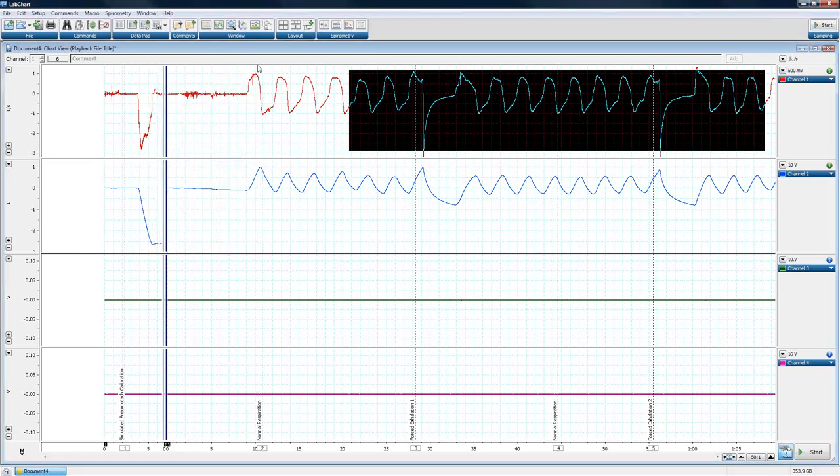Now we're going to talk about settings. We can access the spirometry settings from the spirometry menu. You see we have about 4 options here: settings, data window, flow volume plot, and report. But of course, we'll talk about these in turn later. However, right now I just want to talk about the settings of how to set up the spirometry extension to actually perform the calculations we want out of it.